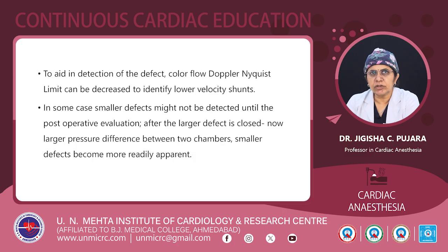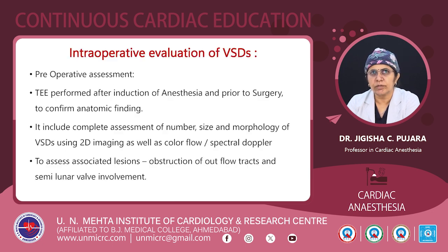To aid in the detection of the defect, the color flow Doppler Nyquist limit can be, as I said, decreased to identify a lower velocity shunt. In some cases, a smaller defect might not be detected until the post-operative evaluation after the larger defect is closed. Now, a larger pressure difference occurs after operation, as the larger defect is closed between the two chambers. So smaller defects become more readily apparent, and one can see the defect by Doppler dropout and the color flow after closure of the larger defect.